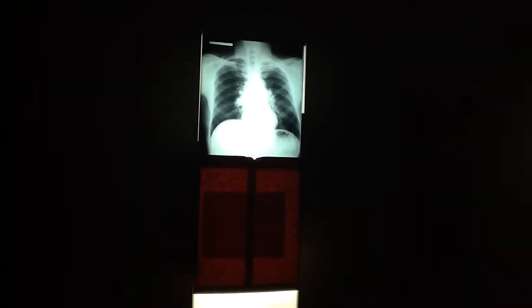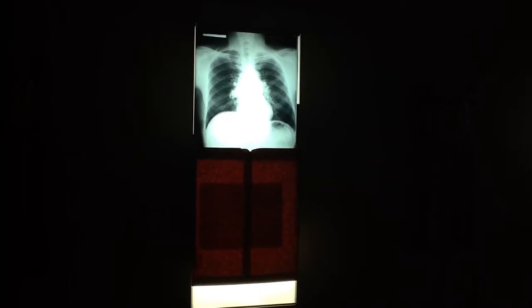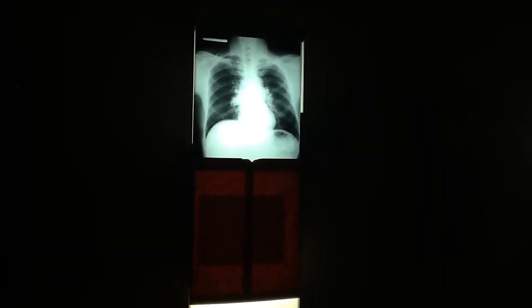What's that density near the gastric air bubble? Right in here. Yes. This is actually in the spleen, and that's contrast material in the spleen. Decades ago, they used a vascular contrast material called thorotrast. And it's no longer used because it was slightly radioactive. And it got stored in places like the liver and lymph nodes and spleen.